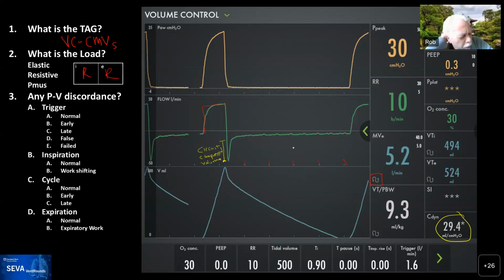This was really interesting, and we can talk about the compliance, but this patient, you can see, we're on 0 PEEP at this point and ventilating her. We did a maneuver to set the PEEP, but the auto PEEP on this patient was 10 to 12. And so the amount of air trapping, and I'll show you some waveforms at the end, was pretty important.